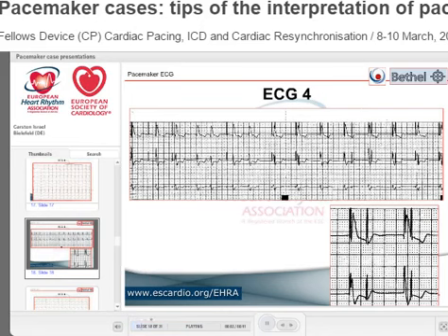So here, the atrial pace is a little bit too late, so the ventricle QRS is in the complete blanking period. It's not sensed. And here's the ventricular spike at a normal AV delay. Here, the ventricular is somewhat different, so it is sensed after the atrial pace. And here you have an example where the ventricular is a little bit faster than the atrial pace.